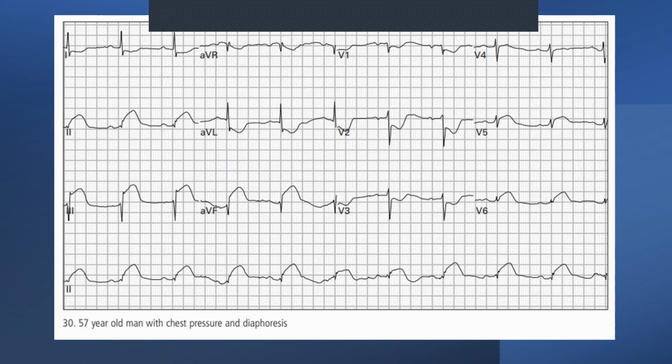So that's going to lead to a decreased preload. And once you've got a decreased preload, then it eventually leads to decreased output and further decreases the preload. So you let your patient go into quite a severe hypotension after. So we know we've got inferior and right. The question is, if it's only there, are there any reciprocal changes? We've got to look for those things as well.